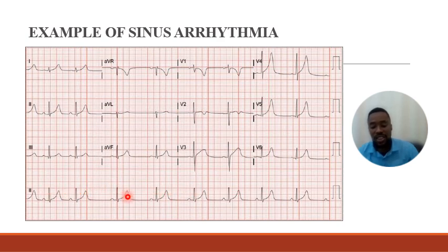1, 2, 3, 4, 5, 6. So you just say 6 times 10, that is 60. So the rate is 60.